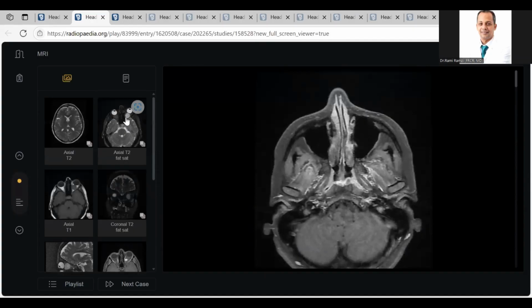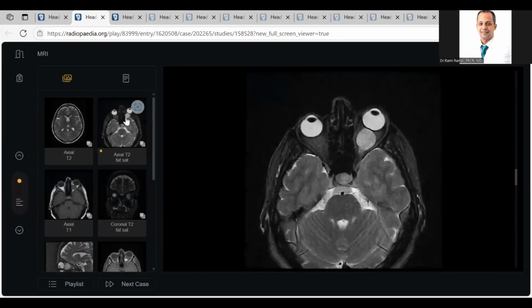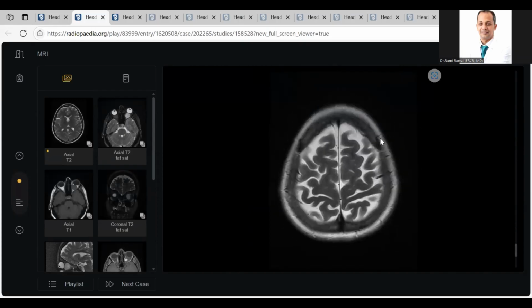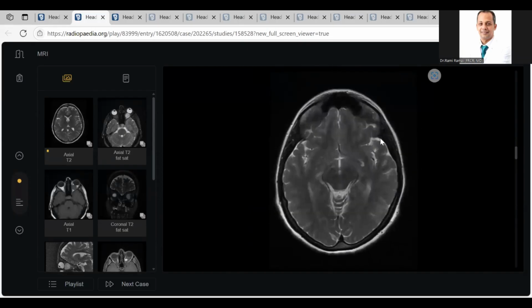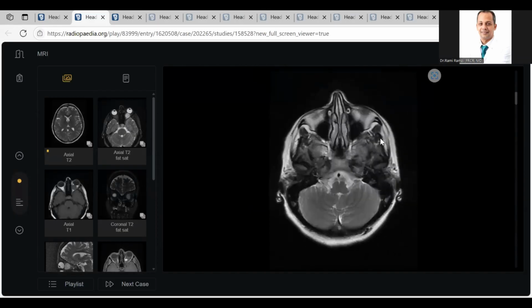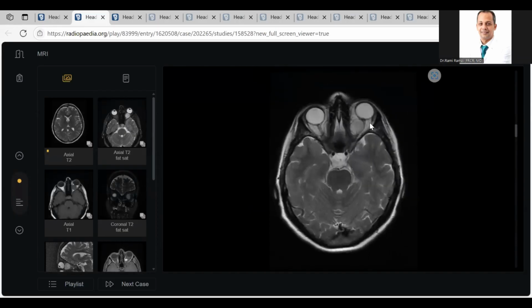At least if we didn't know the exact diagnosis, we should delineate our description well. Why? Here, we can't 100% judge the relation of the lesion and the optic nerve. Second, my colleagues, please don't confine yourself to one diagnosis from the beginning.